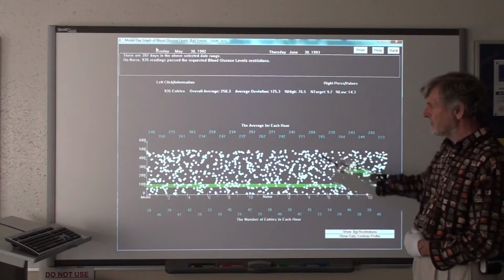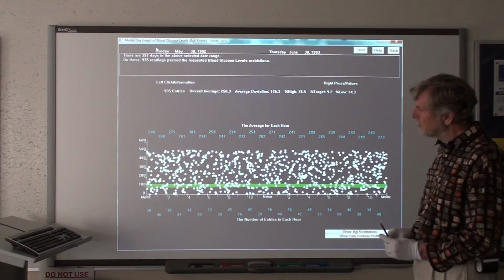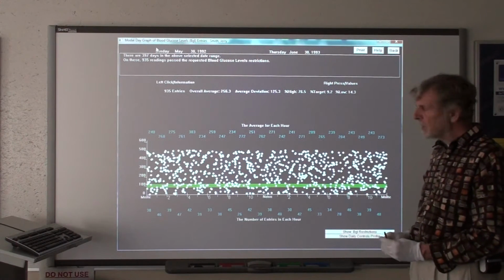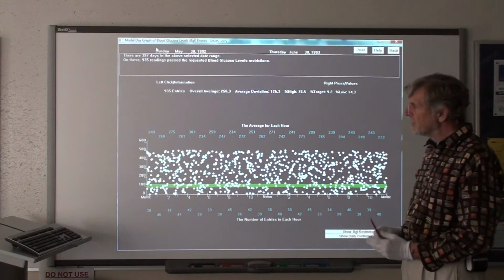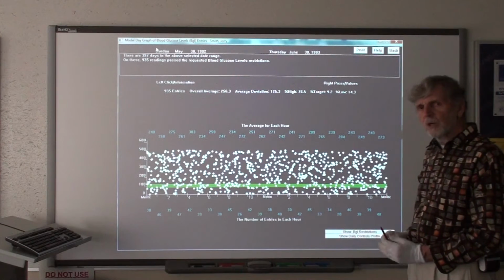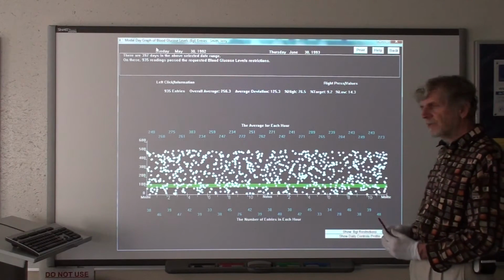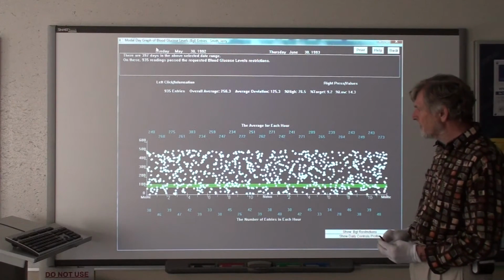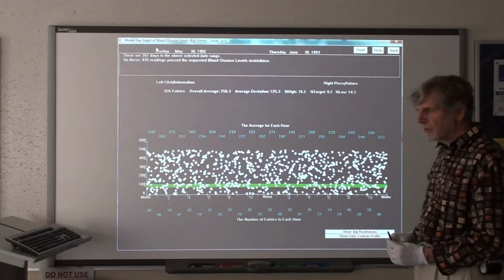All the days in the date range have been coalesced as if they all occurred on the same day. So you have each of the readings graphed only against their time of day, irrespective of the date on which they occurred. And you can go over this with a patient. Now, one of the powers of the level system and using it with Internet Data Storage is while the patient is in your office on his visit, then you have access to his very latest data, and you can confer together on the graphical presentations and decide on the best course of action. For example, if all of his high readings were occurring in the early afternoon, then you could examine why that might be happening.